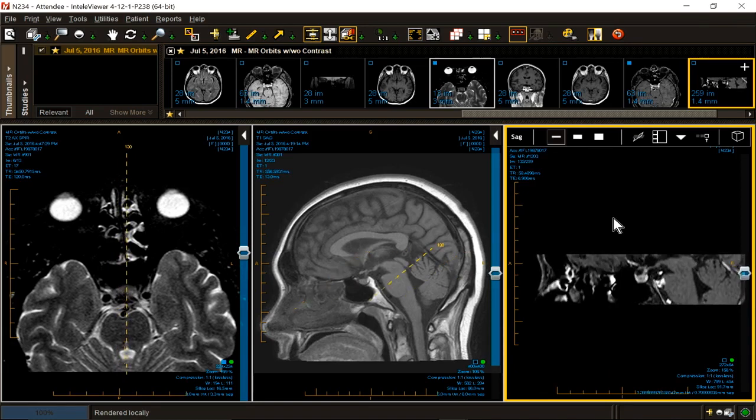I would say there's fusiform ectasia, but not an aneurysm. Would you all agree? Maybe that right there? Is that what's bothering you? So it wouldn't be off the tip, would it? I wonder if it's an atherosclerotic plaque with a flap, maybe with either an aneurysm or a pseudoaneurysm.